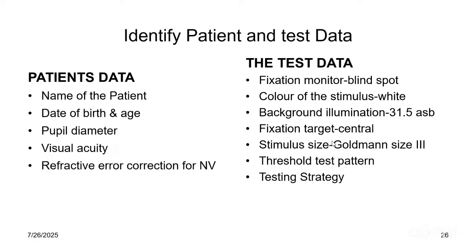Like we said, there is an age control data already in this machine that is used in comparing the patient to the normal population. So if, for example, a patient is about 50 years old and you put in 30 years old, that's a great difference. The analysis you'll be doing on the field will not be appropriate.